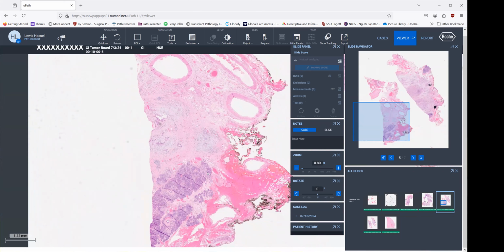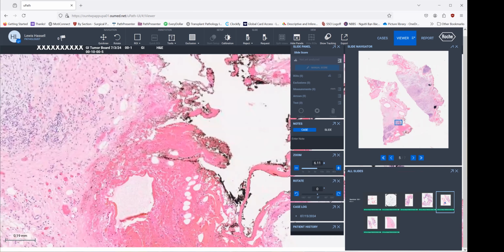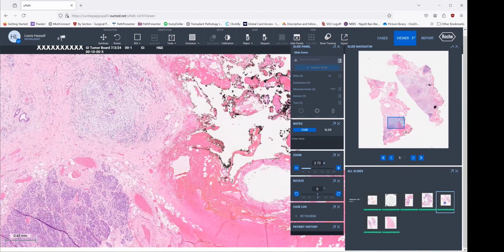And with that procedure, typically they will perform frozen section on the margins. And that can be challenging in a neoadjuvant setting. So we typically freeze the close margins, which can include the uncinate process margin, the retroperitoneal margin, if you will. And we typically ink that with black ink, which you can see on the surface here. And it comes through nicely for frozen section.